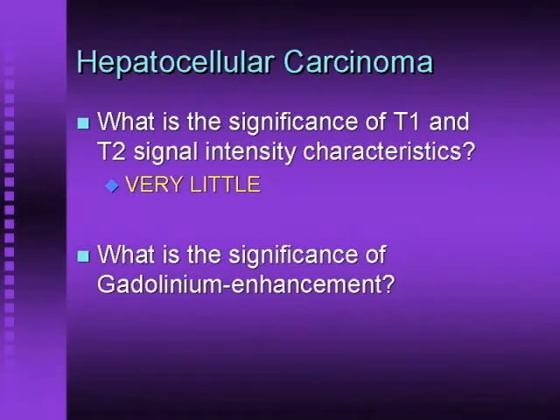So to answer this question, what's the significance of T1 and T2 signal intensity characteristics? Very little. I wouldn't put much weight on this at all. On the other hand, let's talk about gadolinium enhancement.